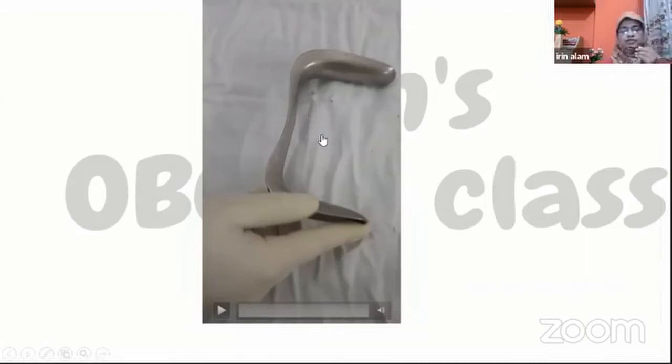What is it used for? It is used in gynae for diagnostic DNC, for DNC due to any cause such as incomplete or missed abortion, or evacuation and curettage. It is also used during vaginal hysterectomy and any type of vaginal operation. It retracts the posterior vagina.